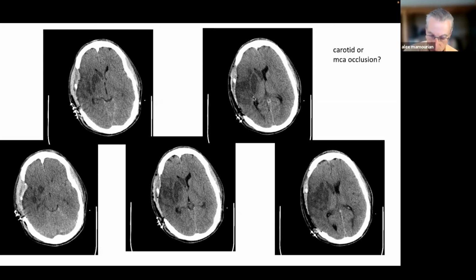If you look at this vascular territory involved, this is the lentiform nucleus, right? This is the thalamus. Thalamus we know is a posterior circulation structure, so that seems fine. It makes sense that this would be involved with an MCA territory infarct. This is MCA territory as well. But as we go down through the slices, you can see we're out of the ventricles, down lower. You see this involvement here and here of the most inferior portion of the caudate head.